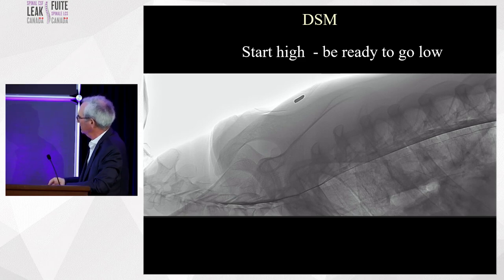Very commonly, these leaks are high. But as you look more inferiorly, you can see the contrast is already coming out, filling the spinal longitudinal extradural collection and falling by gravity against the vertebral bodies.